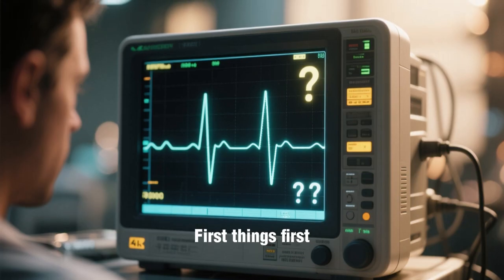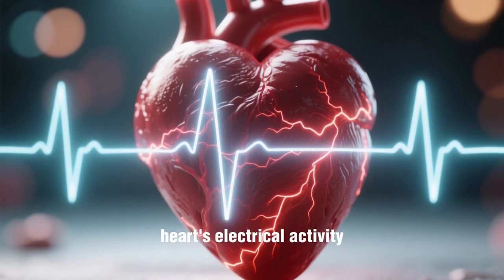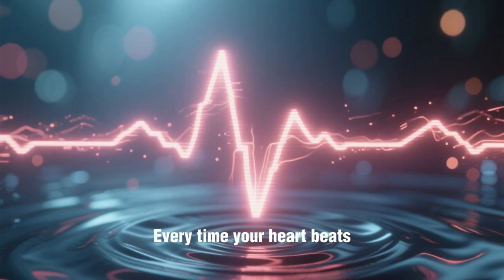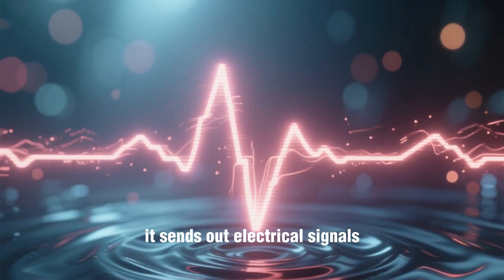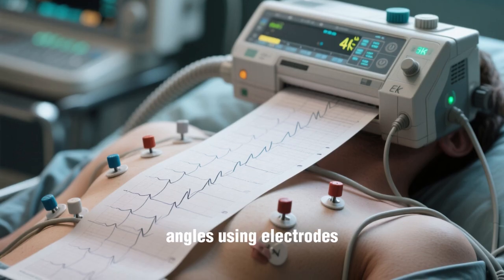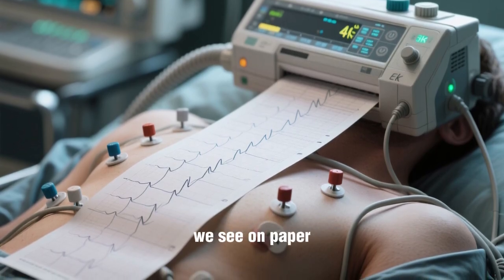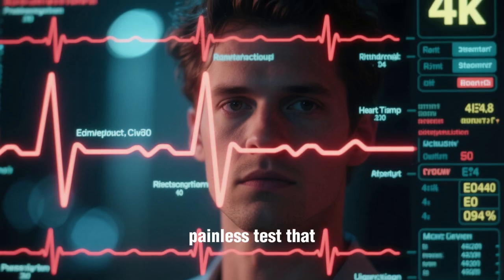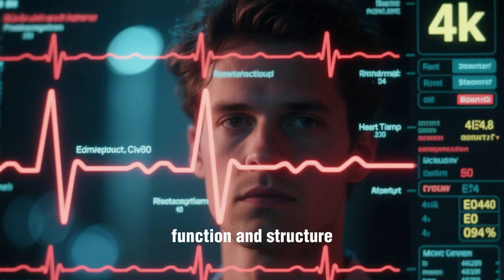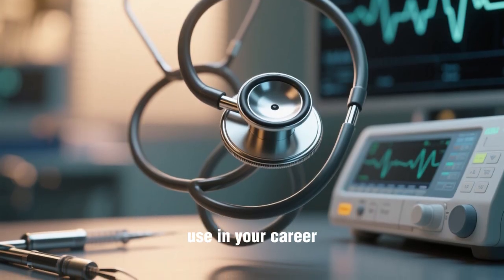First things first, what exactly is an ECG showing us? It's a recording of the heart's electrical activity. Think of it as an electrical snapshot. Every time your heart beats, it sends out electrical signals. The ECG machine captures these signals from different angles using electrodes placed on the skin and translates them into the waveforms we see on paper. It's a non-invasive, painless test that gives us a ton of information about the heart's function and structure. It's one of the most common and crucial diagnostic tools you'll use in your career.